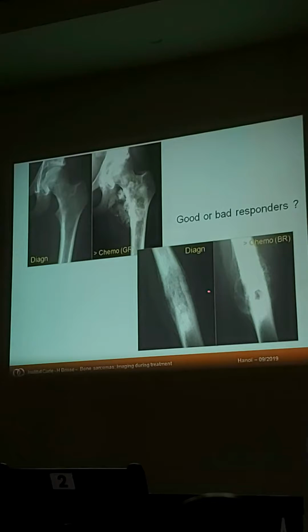Còn trường hợp thứ hai thì là một cái tổn thương sau điều trị đáp ứng hóa chất thì vẫn còn vùng tiêu xương này, kèm theo có phản ứng vôi hóa ở trong vùng phần mềm và vôi hóa trong cái phần phản ứng màng xương, thì cái hình ảnh này cũng không thể nói được là nó là đáp ứng tồi, mà chỉ nói được là có đáp ứng với điều trị hóa chất và vẫn còn tồn tại những cái hình ảnh như thế này. Và cái tổn thương này nó không đạt được đến 90% hoại tử.